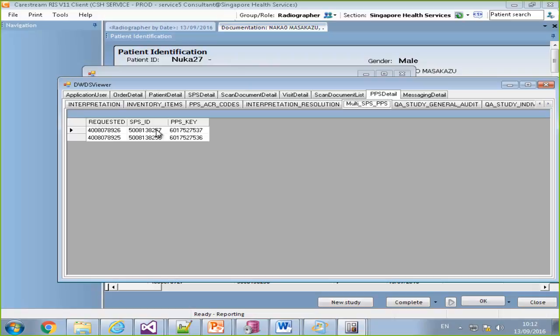If an SPS code doesn't have a Document Together key, it can be documented together with any other study, and then it's just the old documentation. Except the change study button will still be inside, and you can still add more than one study. It just won't be together.